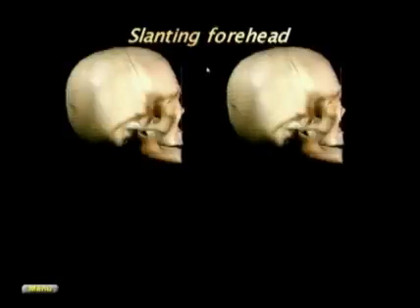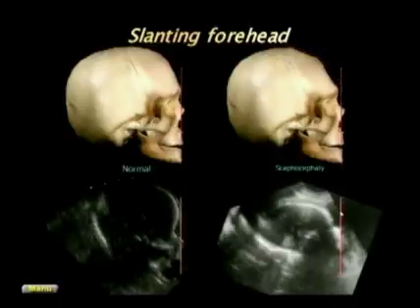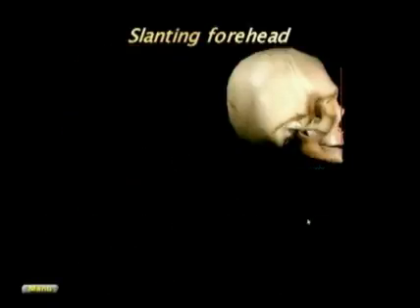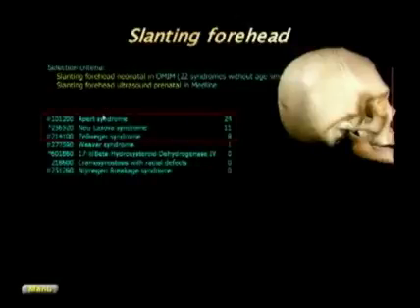The opposite of a bulging forehead, of course, is a slanting forehead, and this is the appearance with the drawing and with the ultrasound image. This is a case of scaphocephaly, and we discussed scaphocephaly a few slides ago. And there are much fewer cases of slanting forehead.